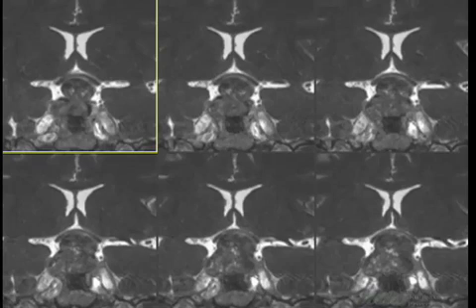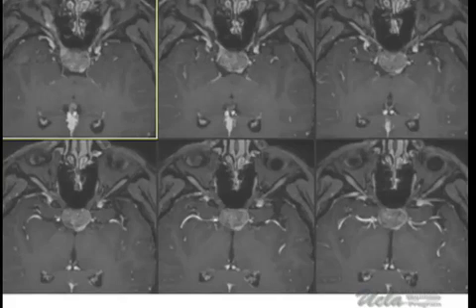And then one more picture to show you. This is the post-contrast BrainLab study. Again, this is a thin cut, 1 millimeter thickness post-contrast study. This is also helpful to see the normal pituitary, which you can see as a very intense enhancement. So right here is the normal pituitary. That's how you can delineate it even with a big tumor. You can see the normal pituitary has a different, more homogeneous, more intense enhancement compared to the rest of the mass.